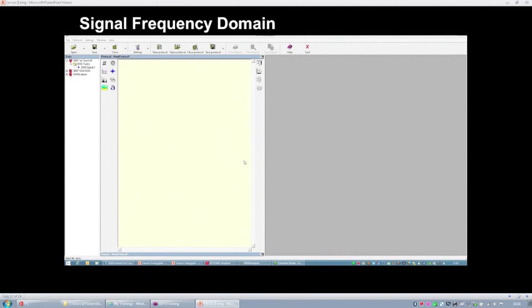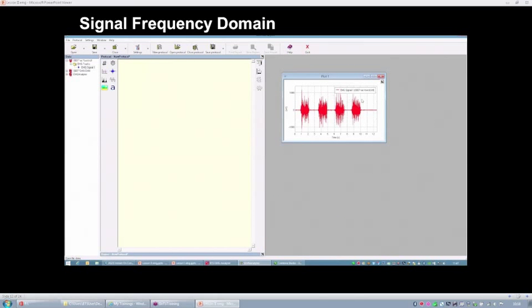So now I want to show you how you can compute the spectrum by means of our EMGAnalyzer application. So this is an example signal. Imagine that now we can compute the spectrum. We have a specific block in the application to compute that. You can choose between the DFT, that is the discrete Fourier transformation, or the periodogram of Welch.